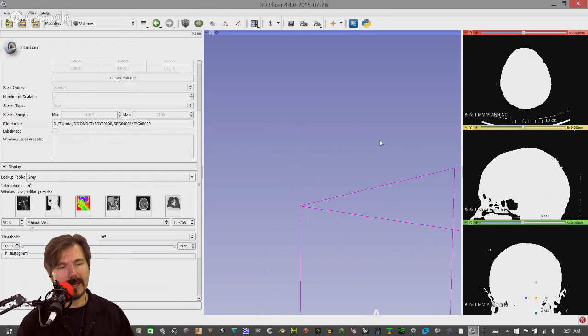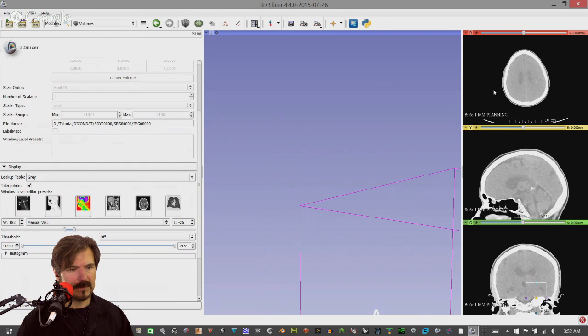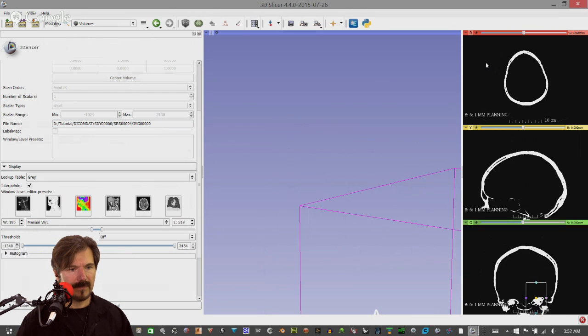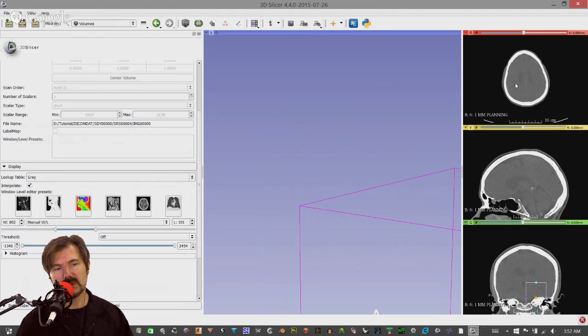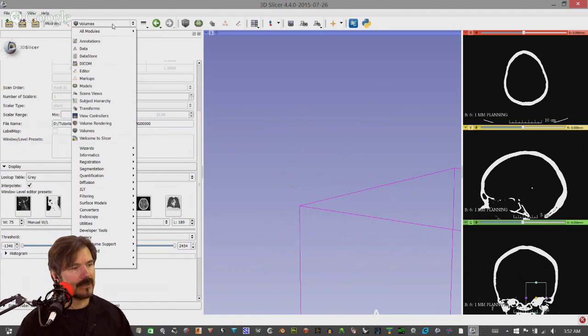All right, so you now can go back. Let's choose one of these others here. There we go. And now we want to create a 3D model of it. There's a couple of ways to do this. They have an algorithm called watershedding. And what that allows you to do, if you just want the brain and you don't want the bone, you apply that tool. And let's see if we have, I don't know if I loaded it up here.